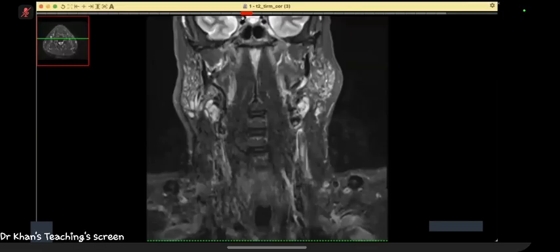So my conclusion is bilateral parotid gland enlargement with innumerable high signal foci. This could represent an inflammatory / infective process, or it could be a malignant process. Just trying to think, it's not pleomorphic. Okay, thank you.